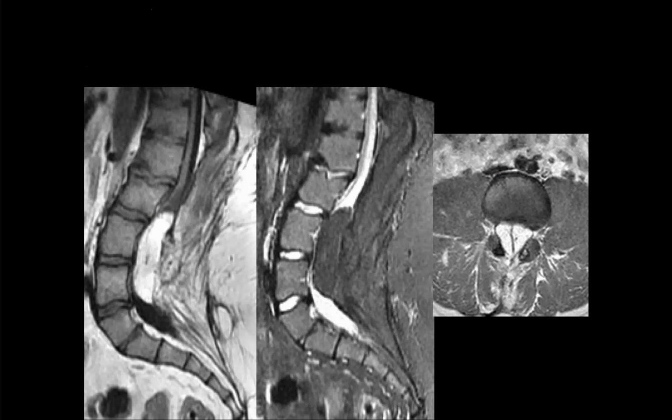Okay, so sagittal T1 and T2 images showing T1 bright, T2 isointense, I guess, maybe a little signal. It looks like it's actually attached to the spinal cord. It looks like there's a cleft in it. The cord is way up here. Oh, yeah. These are the nerve roots coming down here.